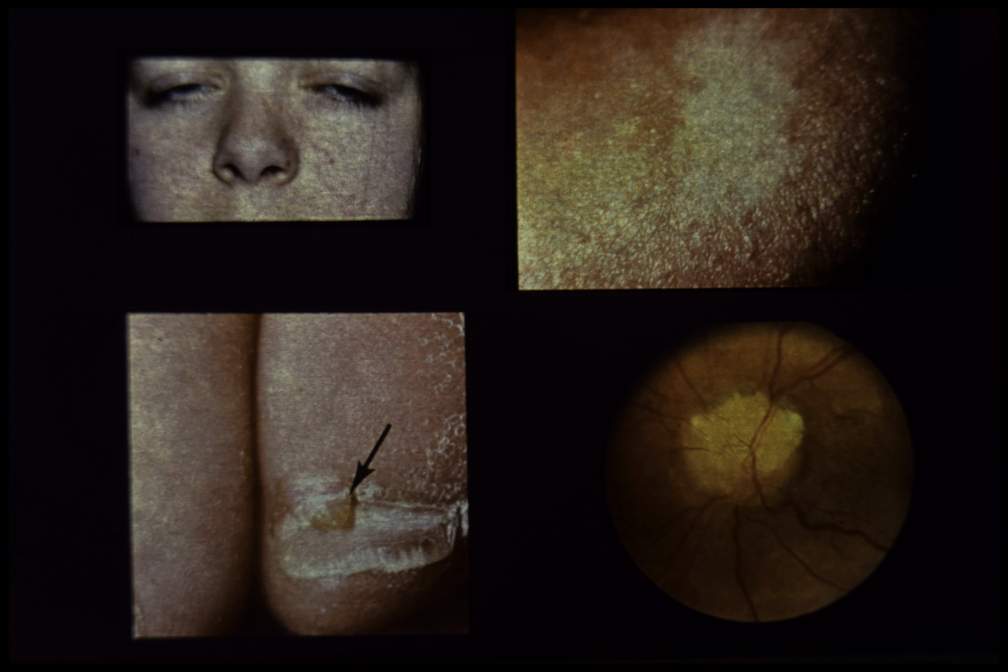The optic disc hamartoma shown lower right has been called a giant drusen or giant glial astrocytoma. This mass is similar in nature and composition to the smaller buried drusen of the optic disc discussed in an earlier section of this volume. Tuberous sclerosis is transmitted as an autosomal dominant.